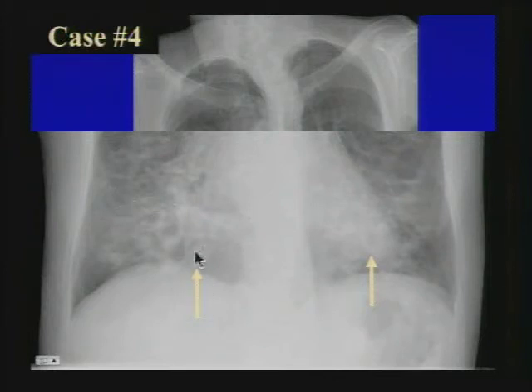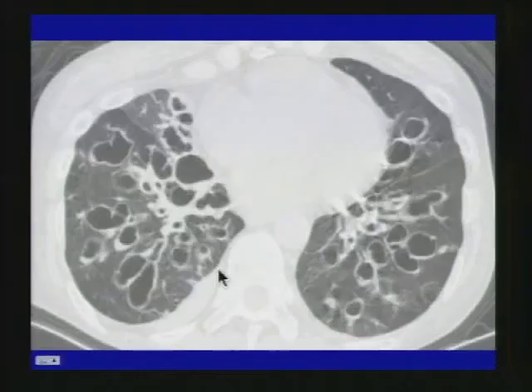Some of them have these little demi-lunes, where you have some mucus layering within them, but it is bad bronchiectasis. Bronchiectasis is a very non-specific finding. There are three types: cylindrical, varicose, and cystic. These are three types of inflammatory bronchiectasis. Cystic bronchiectasis, which is what this is, is a very non-specific finding.